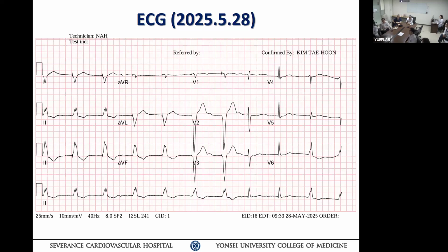I want you to look at the aVR, very first complex, the PR, just before that, a little to the left, a little to the left. Yes, right here. What do you see? Kind of two bumps show up there. Also, you can see it in aVL as well. Extrapolate a little bit there, right? So that suggests what?